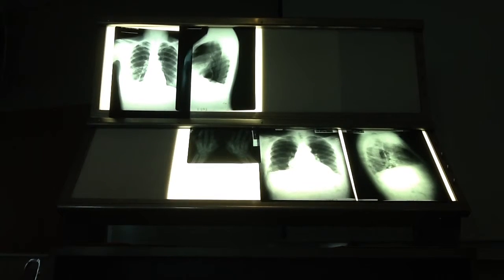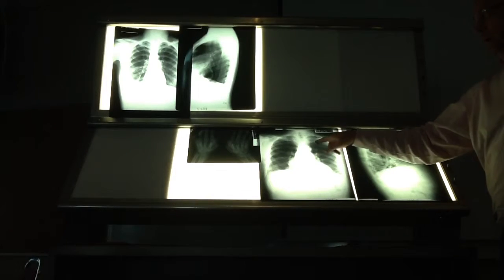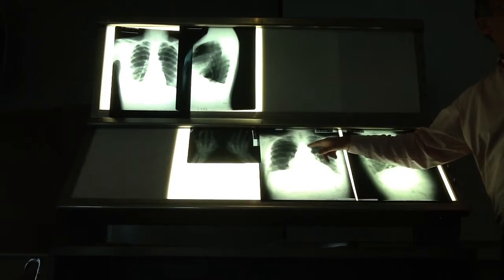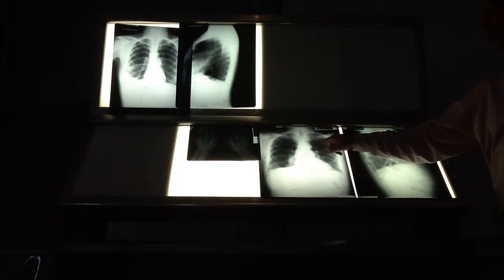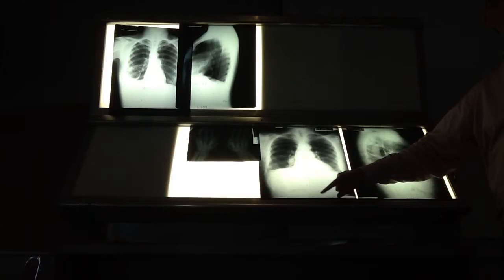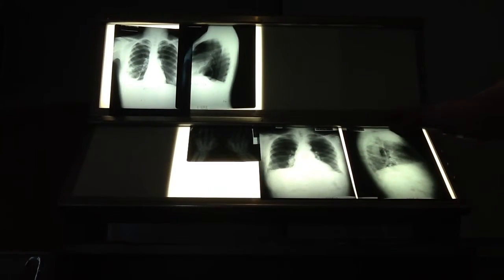All right. So this is just that honeycombing and the scarring here. Here's a bit of cephalization again. You call that the Viking hat sign, okay? Which is good. Why does this happen in this disease? Why would this happen here? What is the cephalization? Where they need more blood flow.